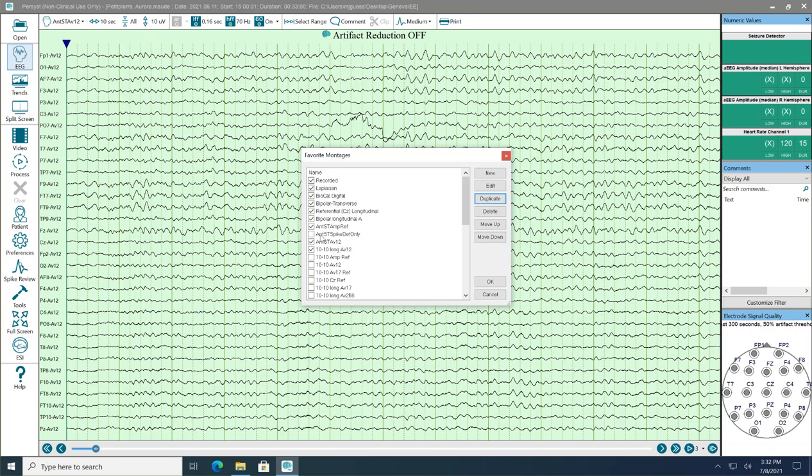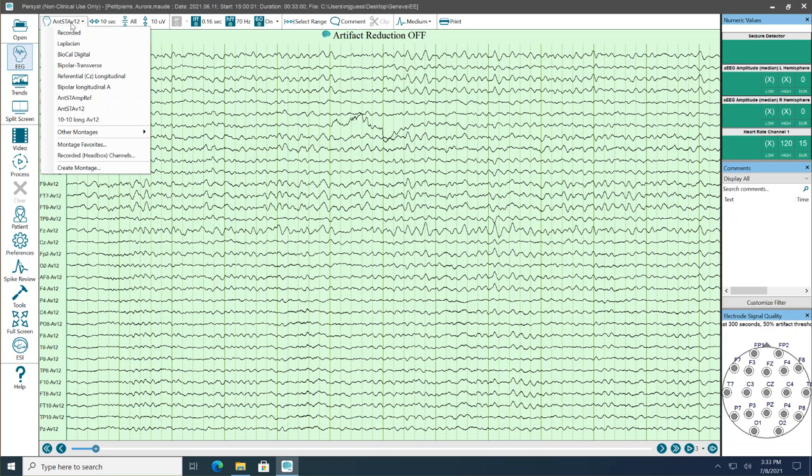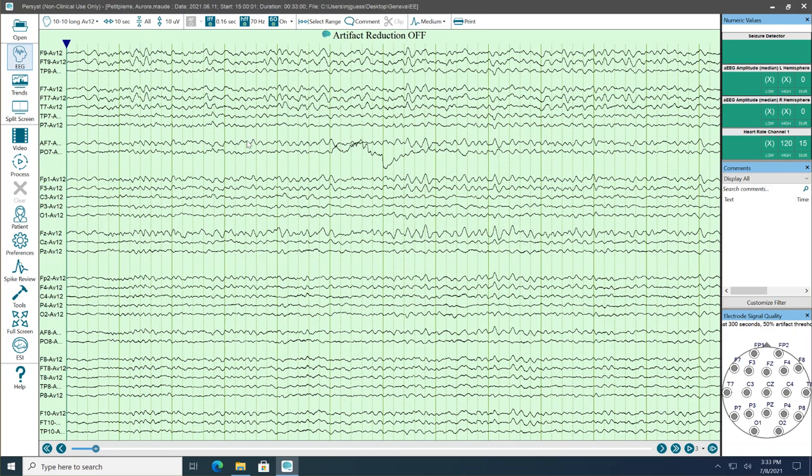So let's say I don't want to have this in my favorites, so I don't inadvertently modify it. I have a duplicate of it here, and we'll put it in a 1010 montage as well. So now it doesn't show up anymore here, and I can look at a 1010 montage. Now this montage includes all the 1010 positions, but this recording doesn't have all the 1010 positions modified. And so there's some gaps along the way.